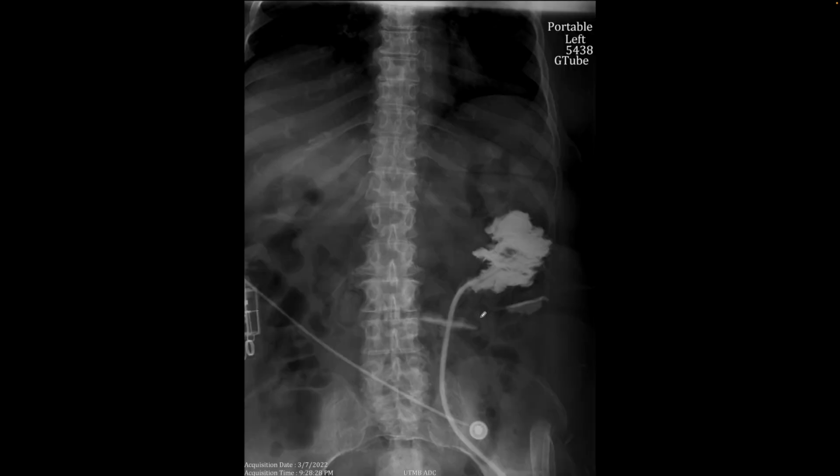This is our next interesting patient, where on this single radiograph, frontal view of the abdomen, which includes a part of the chest, abdomen, and some pelvis, we are looking at a G tube which has been inserted. Here is the tube, and some oral contrast has been injected to see if it is in the bowel. This does not look like it's opacifying the lumen of the bowel.